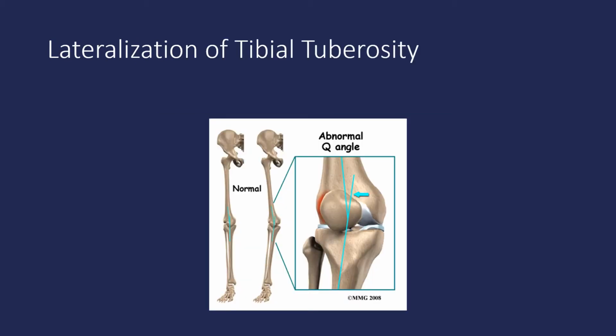The position of the tibial tubercle is crucial for the inferolateral force vector of the patella. In a normal joint, the tibial tuberosity lies vertically under the femoral sulcus, directing the force vector inferiorly during knee bending. However, if there is excessive lateralization of the tibial tuberosity, the patella is pulled laterally during flexion. Therefore, excessive lateral displacement is considered a risk factor for instability.